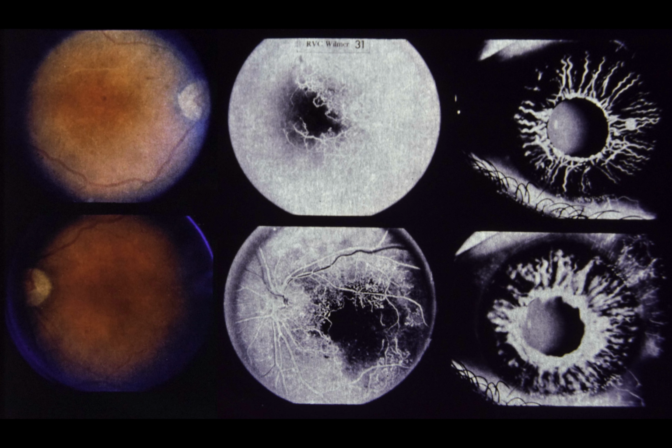Since choriocapillaris adequately nourishes the fovea, and since existing retinal capillaries adequately nourish nerve fibers in the papillomacular bundle, this patient has maintained 20/20 visual acuity in both eyes. In addition to capillary closure in the macula, fluorescein studies of the periphery demonstrated extensive capillary dropout in both eyes.